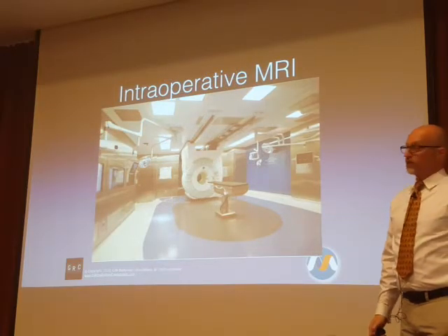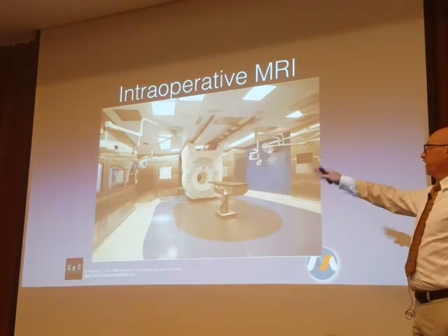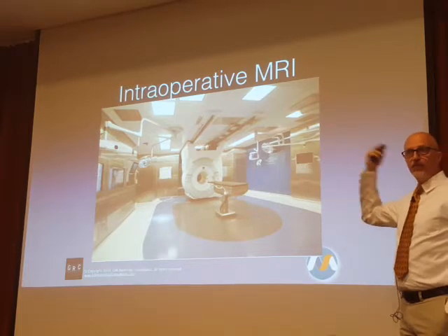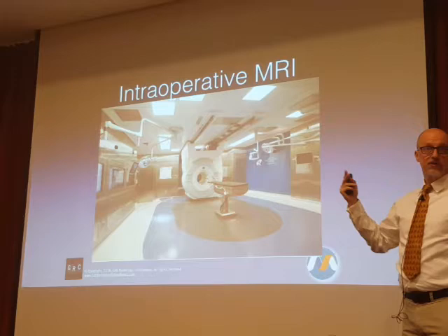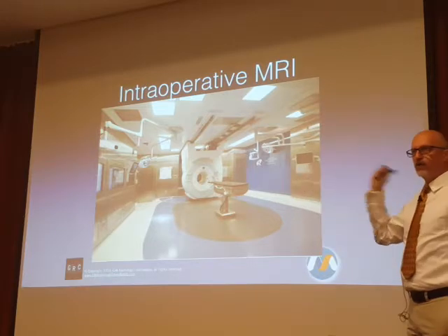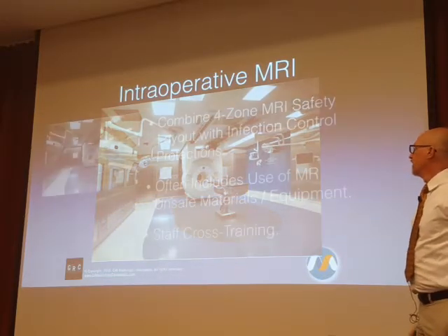Intraoperative MR systems. This is one of the IMRIS ones that actually the MR moves along a track on the ceiling. There are other systems where the MR is stationary and you move the patient back and forth.